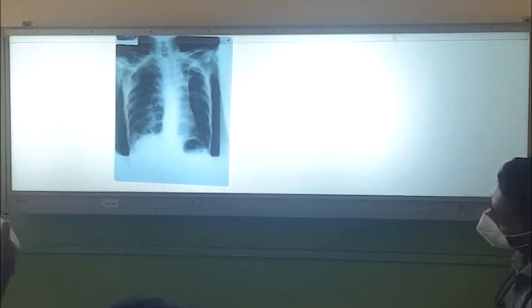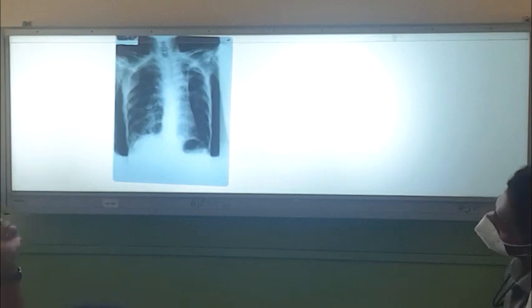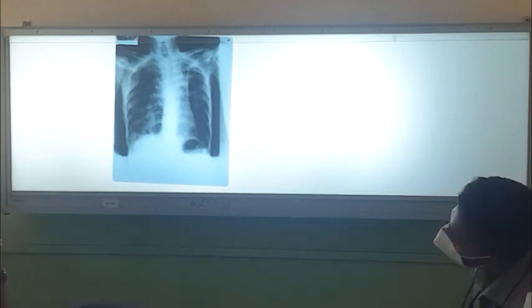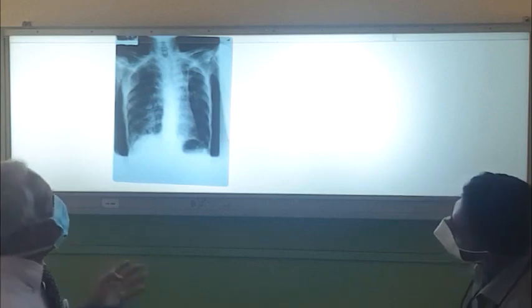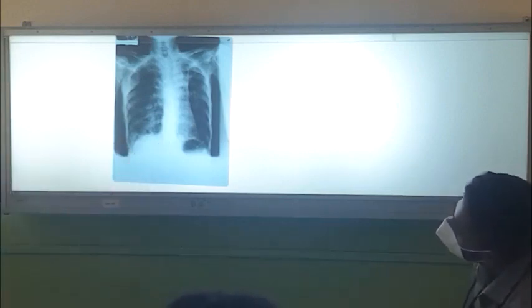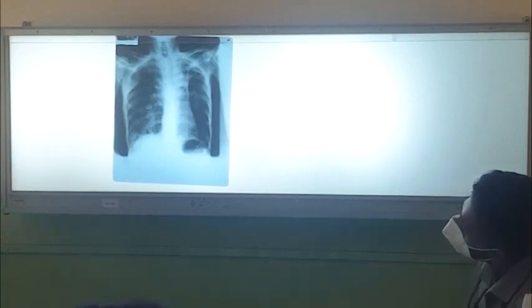Some people detect this. So I told you to see X-rays, you look at the trachea, then bronchi, then lung tissues, then abdomen, then ribs. Everything you have to look at. Anything wrong there? Sorry? So this is an AP film, lying down, wasted patient. Anything obvious there?